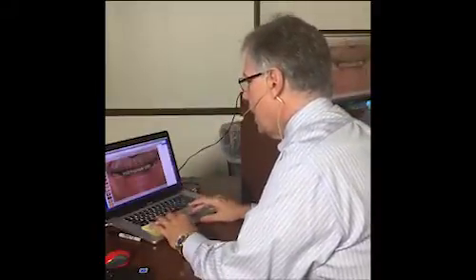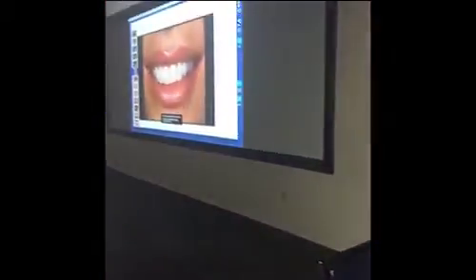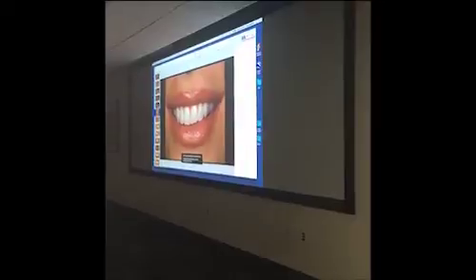If I wanted to draw, so actually let's draw around Janina's lips. What I do in this one is I go shape, draw with pen, and what I can actually do now is pick something to follow. And in this case, I'm actually going to go Control Command X and change that. I'm going to escape because I went down too far. I was drawing something different than anticipated.